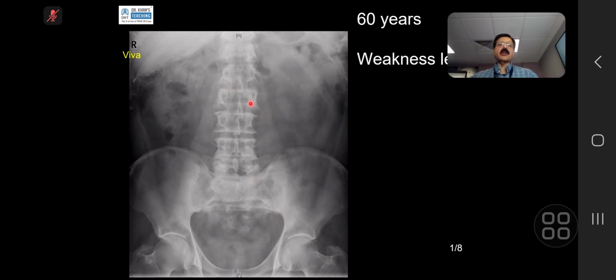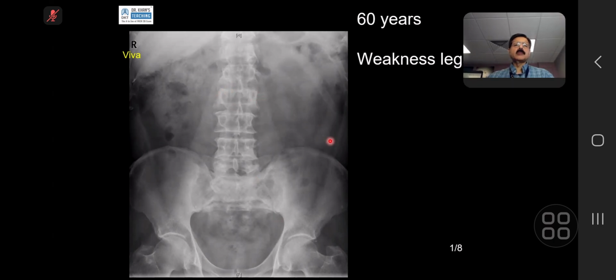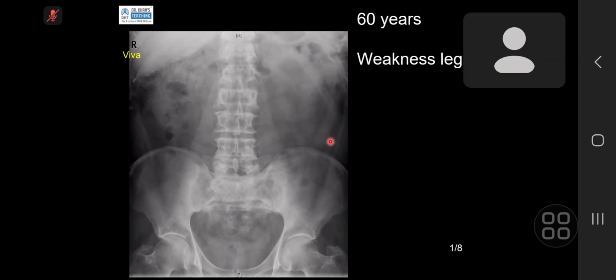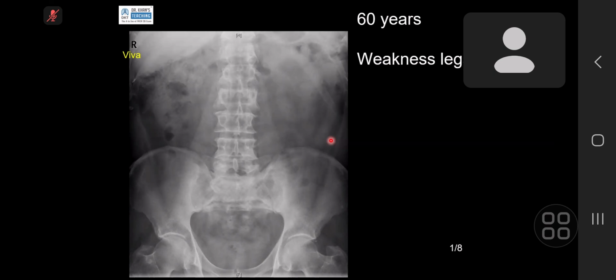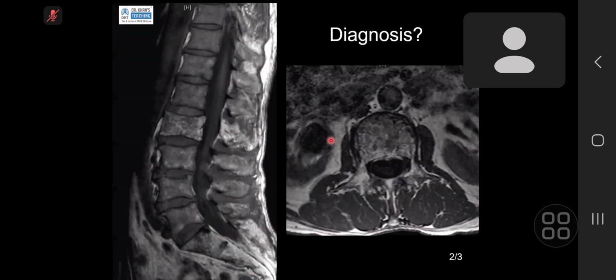Okay. If you concentrate here, what do you think about this vertebra? In this vertebra, I cannot see the pedicle very well. What about the size, the mediolateral dimension? Yeah, there is a reduction in the vertebral height in comparison with the rest of the vertebrae.